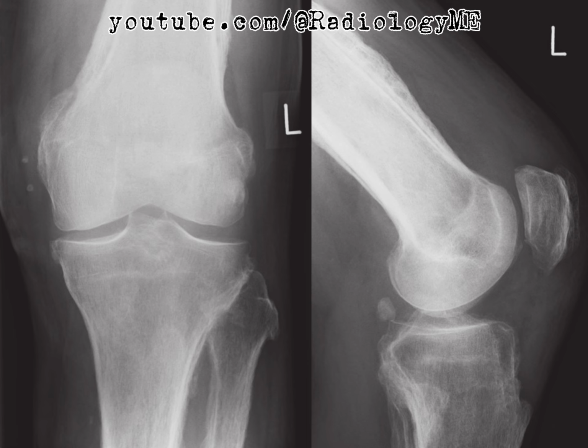If this finding were unilateral, I would be considering a vascular cause, or perhaps even a local trauma or infection. However, with bilateral involvement, my thoughts are more aligned with systemic causes. Given that the periosteal reaction is isolated to the diametaphyseal regions and spares the epiphyses, the differential diagnosis is further narrowed down. The possibility of hypertrophic osteoarthropathy, HOA, comes to mind, particularly secondary HOA, which is frequently associated with chronic pulmonary diseases, especially bronchogenic carcinoma.